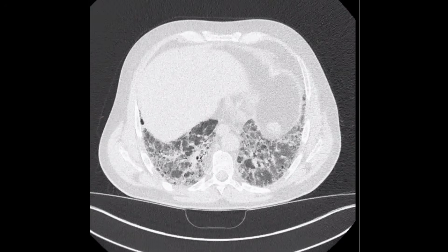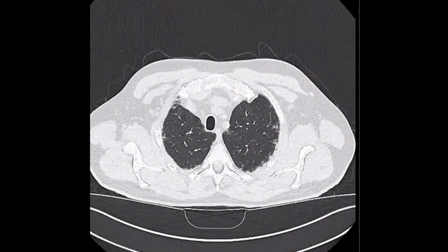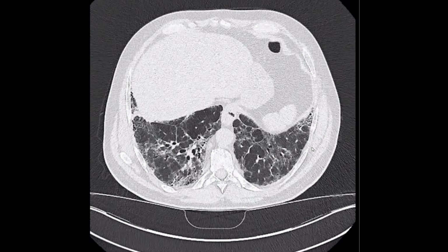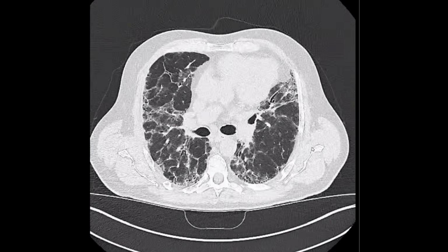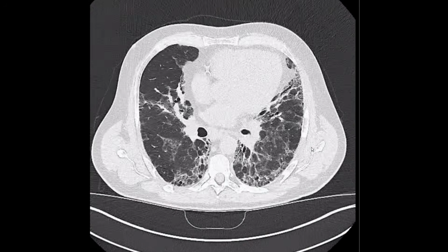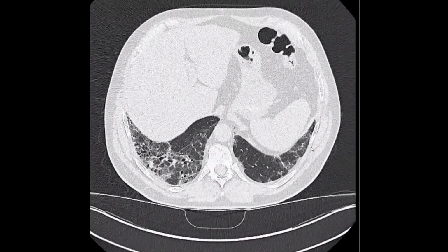Okay, that's fine. So what's your diagnosis? As this is the pattern of interstitial lung disease, predominantly usual interstitial pneumonitis. So I am thinking this one is not UIP. UIP will not be associated with air trapping. It could be due to a previous hypersensitivity pneumonitis pattern. Perfect. Chronic. Perfect. We have two types of hypersensitivity pneumonitis. What are these types?